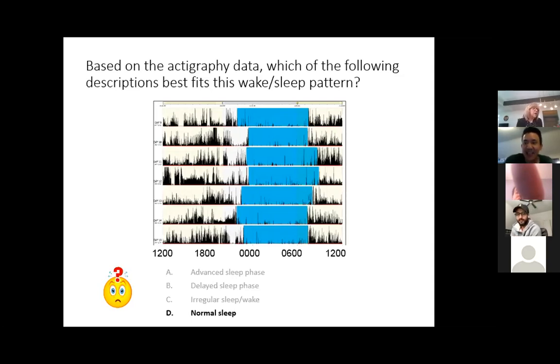This is kind of what normal amount of movement is in sleep. And you might say that when people are in REM, you're supposed to be paralyzed, but I think there are some more arousals and stuff in REM. Okay? All right. So this is our kind of framework. Let's have some more fun.